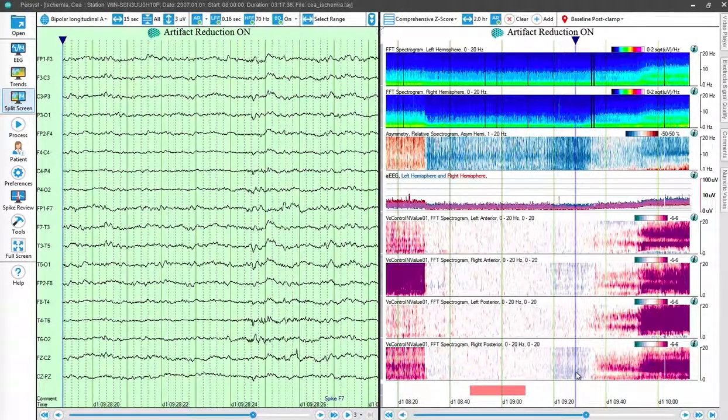That's something that if you've got very slowly evolving changes, these are not that slow, if you have very slowly evolving changes, you can visualize those. Perhaps nothing's happening over a 4-hour period, but it might be very different from something that happened 24 hours before. And so that's the idea of being able to mark baseline, create an empirical null, and calculate differences from that, wherever it happens to be in the recording.